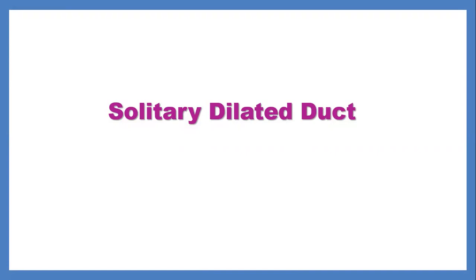Supposed to be BI-RADS 2. Who said BI-RADS 2? Medina. BI-RADS 2. Okay. Yes, before, it was just a dilated duct not associated with soft tissue mass. Yeah, now you start to talk in a good way. You're right. You should not take it like this.